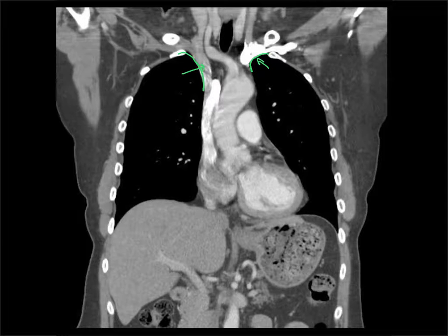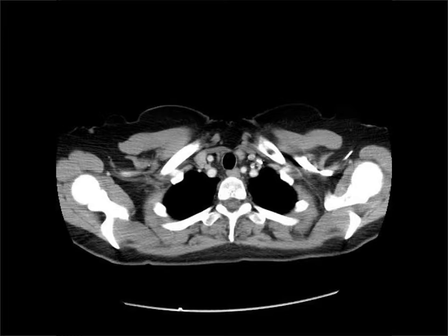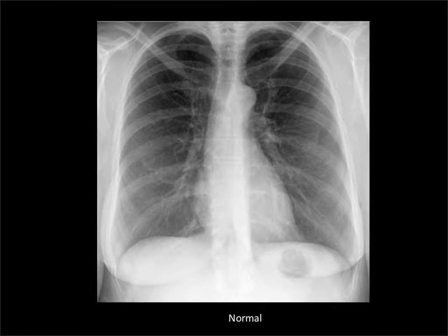Sometimes some of the arterial structures can end up being very ectatic and swinging across as they come off the aortic arch in addition. And looking on an axial CT, it's this interface here between the air and those soft tissues that we're seeing on a frontal radiograph. X-ray beams coming from here, we're looking at these edges. Let's move down a little bit further.